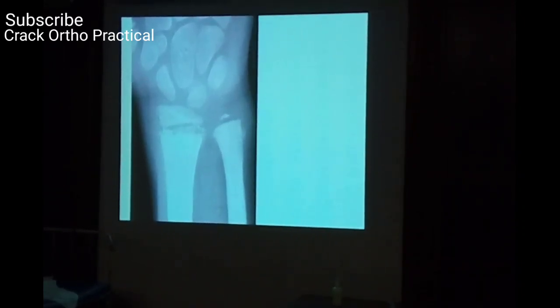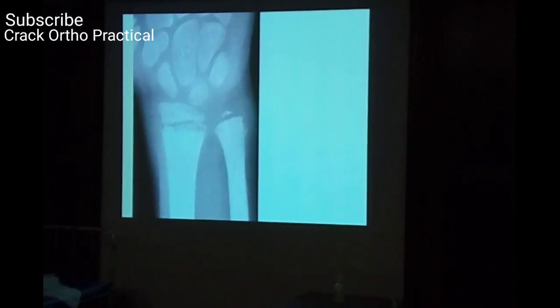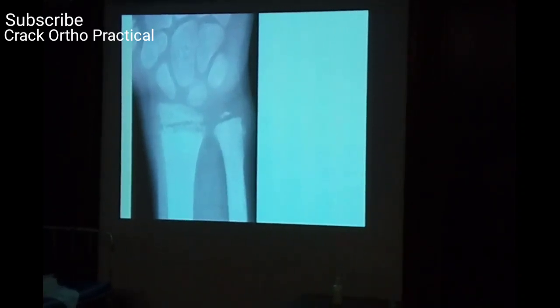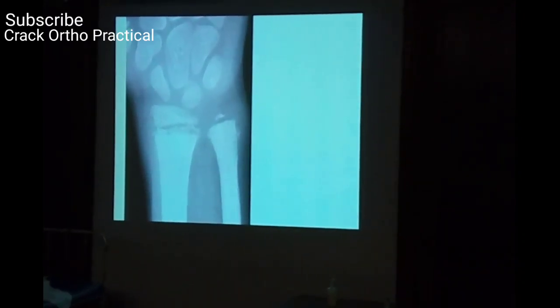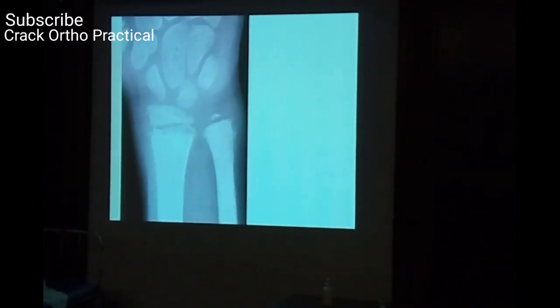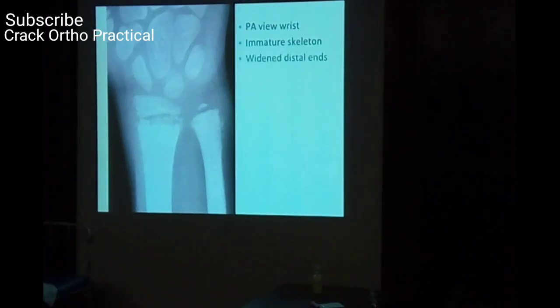Wimberger lesion. So is this a Wimberger lesion? The epiphysis looks quite nicely radiopaque, isn't it? There is no radiolucency of the epiphysis. Healing rickets, that's right. So this is healing rickets where you can now see the mineralization of the growth plate is on.